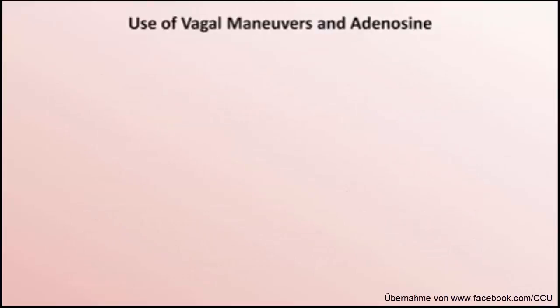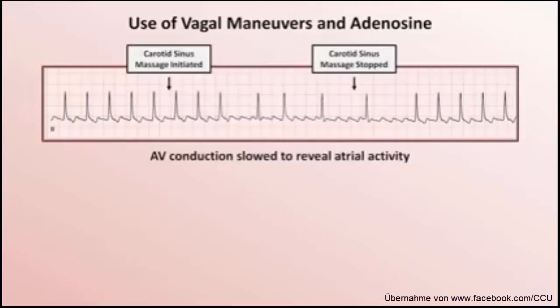Here's what those situations look like on EKG. In the first example, a patient is in a narrow complex tachyarrhythmia at a rate of 150. The treating physicians felt that the EKG baseline had a sawtoothed appearance suggesting atrial flutter, but to confirm, several seconds of carotid sinus massage were performed, which very briefly increased AV block and thus decreased the frequency of QRS complexes to the point where the flutter waves were unambiguous. There is essentially no risk that the carotid sinus massage will terminate atrial flutter, since the reentrant circuit responsible for flutter does not pass through the AV node.